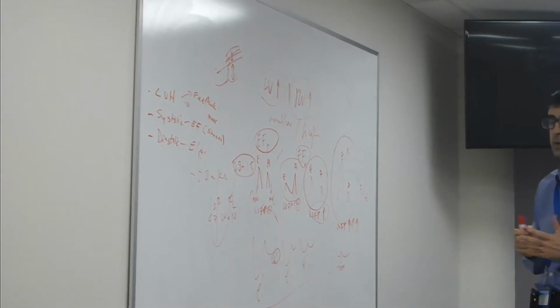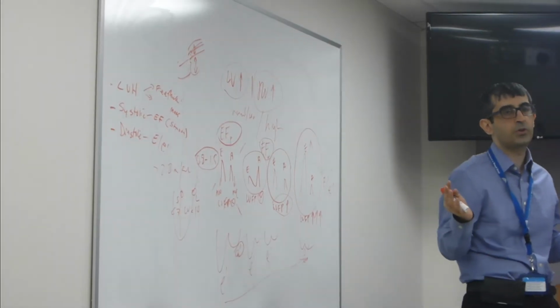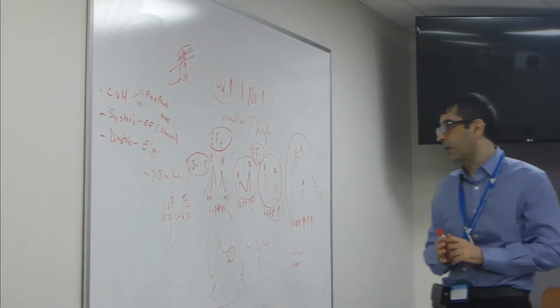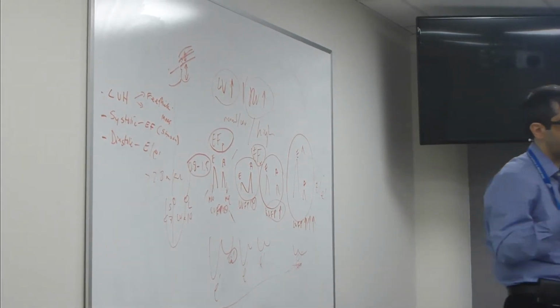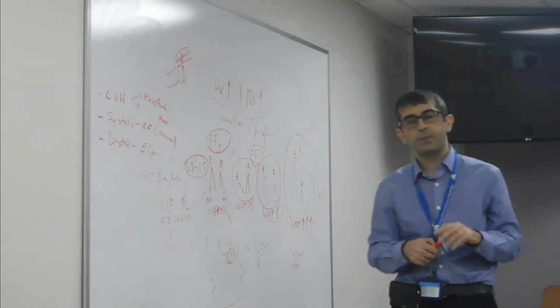Let's say if you have atrial fibrillation, it's very difficult. There's no A wave, you cannot decide what's going on with your E-to-A ratio. Every beat is a different beat, right? So even if you calculate the E-to-E prime ratio, they're not the same beat that you're comparing. You're comparing different beats. Some people still do it, but I wouldn't do it in atrial fibrillation.